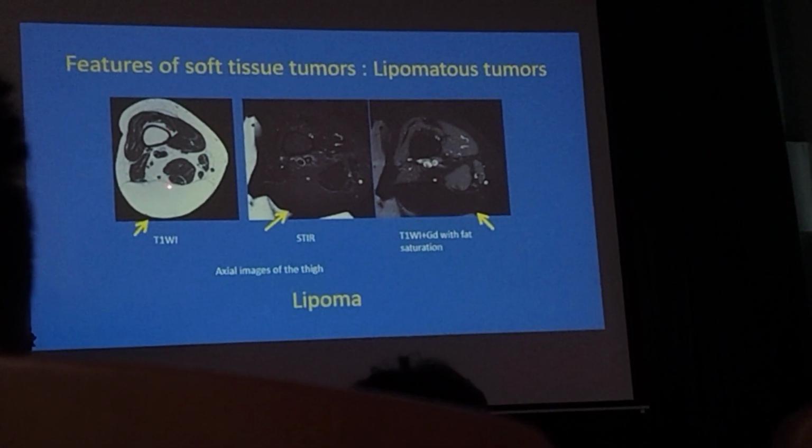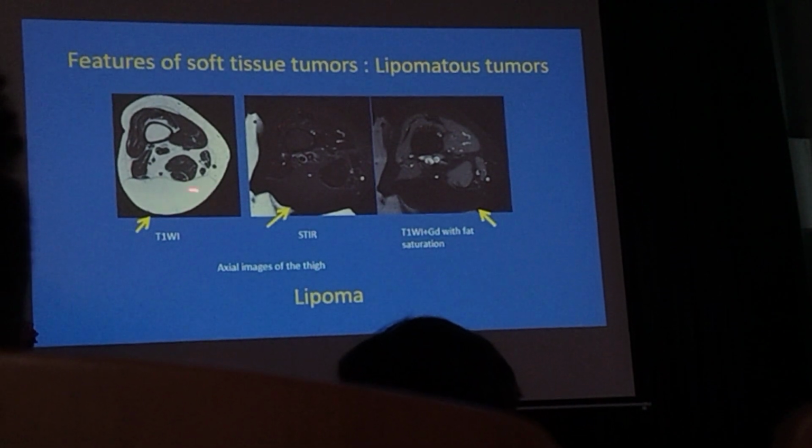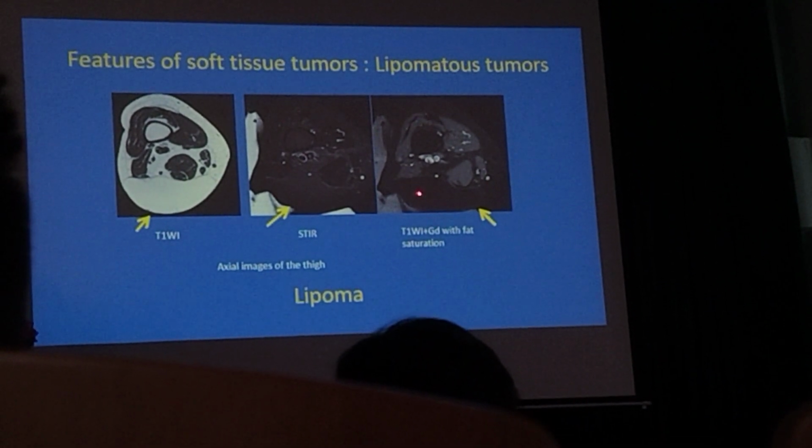Đây là một cái ví dụ của cái lipoma rất là điển hình lành tính. Anh chỉ thấy là một là tăng tín hiệu rất là đồng nhất, xóa mỡ hoàn toàn, và một có cái đôi thì không cản thuốc.